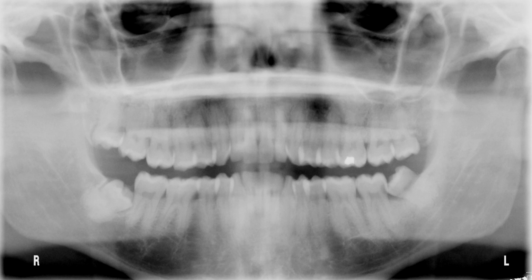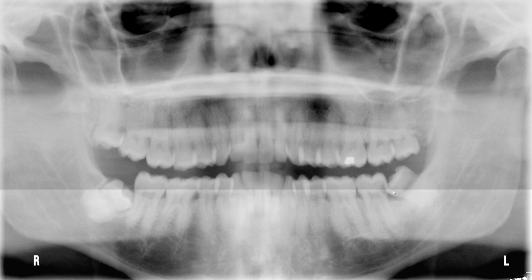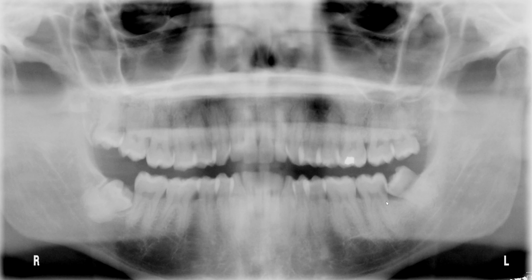This is Dr. Kim. So let's take a look at this panoramic radiograph. This patient is 38 years old. From this, and if you look at the eruption status, you can see that lower third molars are impacted. They are mesially tipped, as you can see, and abutting the roots of the teeth that are in front, perhaps at the CJ level. I think what I want to show is that even though the image quality isn't necessarily the best, let me see if I can actually zoom in.